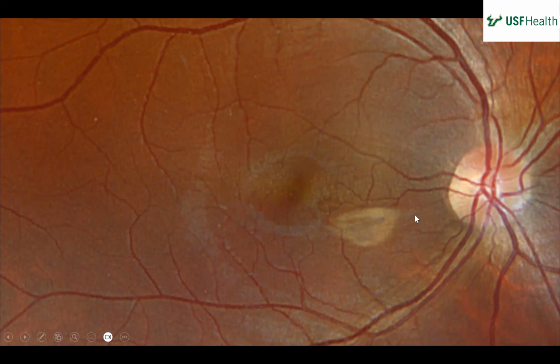Maybe a half disc diameter in size. Do you use disc diameter or disc areas? I said diameter. Yeah, kind of like disc areas, because you're describing an area. Yeah, it's true. Diameter is linear. Area is more accurate. I like that. So it'd be about a half, a third disc area, but go ahead.